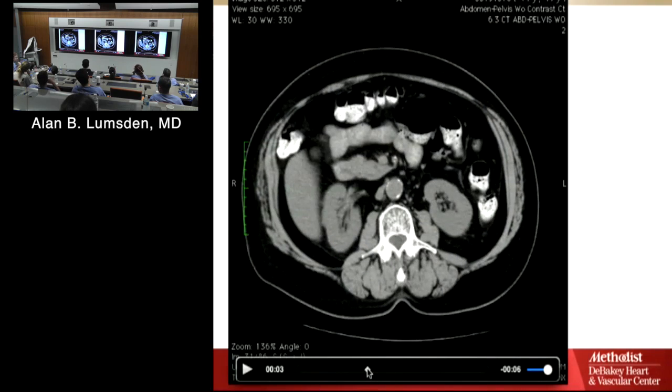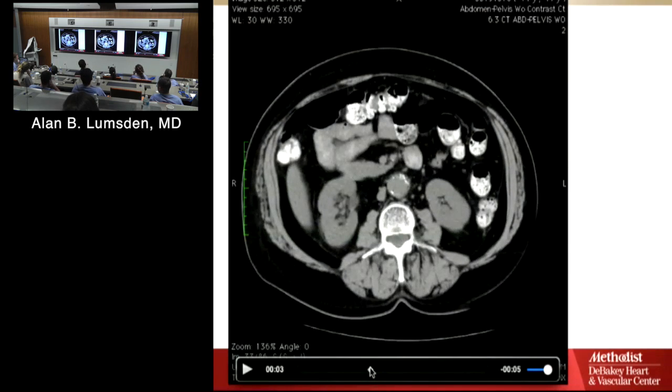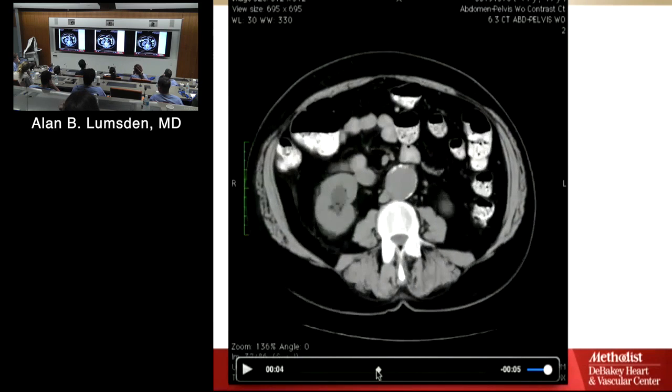What's the next branch? Coming down, red cell, flying down the aorta. We're past the renals. Where do you find the IMA? Between the bifurcation. So that's probably the IMA there. Do you see it? That's probably inferior mesenteric artery. A lot of the time it's aneurysmal. This is occluded. And there's an aneurysm.